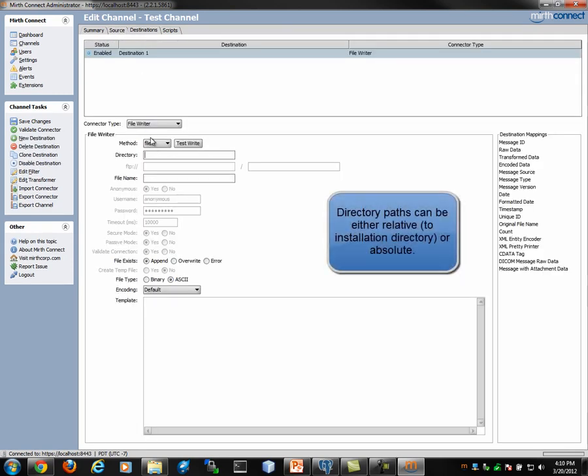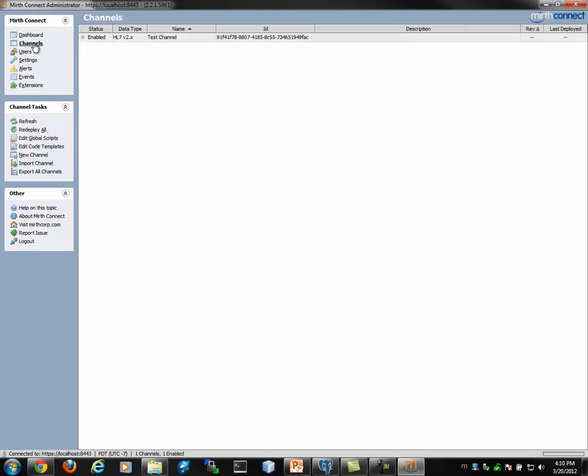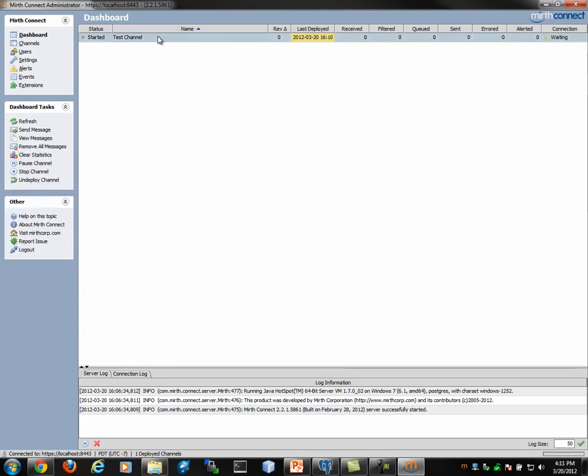I'll write out to c:/test/out. I'll hard-code a file name. And I'm going to drag over the encoded data to write out. Go ahead and save this channel. I'll deploy it. And now I see I have a test channel deployed. Let's go ahead and send a message into this channel.